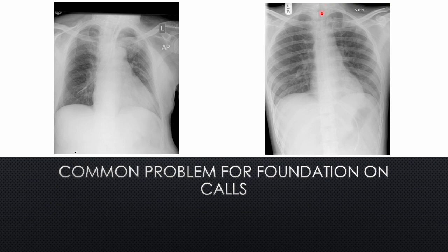On this side, this is the NG tube here coming down. You can see it's staying in the midline. It's past the level of the diaphragm, which is here. It's bisected the carina, which is the junction where the trachea would split. And then the tip of the NG tube is clearly visible over here, below the hemidiaphragm, and it's approximately 10 centimeters beyond the GOJ. Alright, that being the gastroesophageal junction.